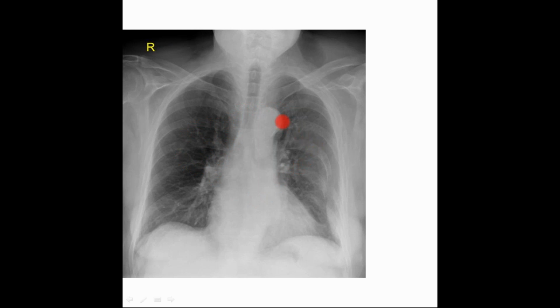There are times, as I told you in the starting, that you will come across X-rays that are not just limited to the lungs and the heart, they are there for the bony rib cage as well. So this is a fracture, this is a fracture. So basically multiple fractures are there on the left ribs. Okay, 3 fractures I can make out. There may be more in the lower part, we cannot be really sure. So always look for A, look for B, look for C, and look for D. At least look for these 4 things in the X-ray.